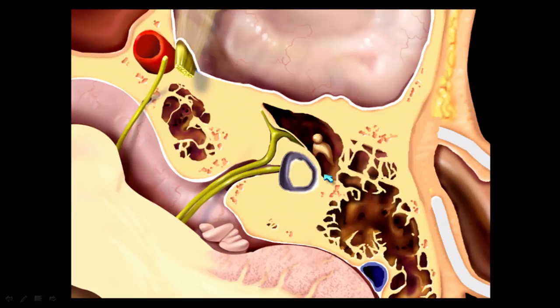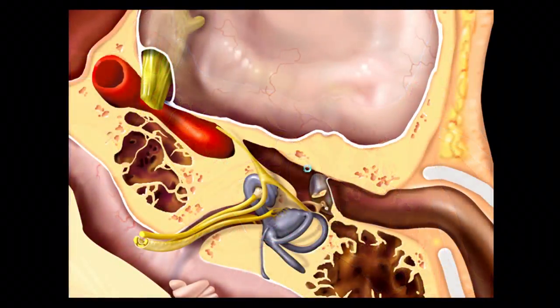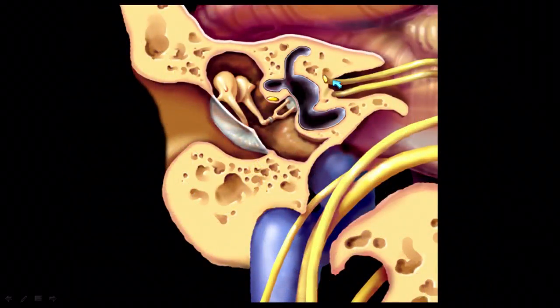Then we have a part going back through the temporal bone, so that's our tympanic segment, and it goes just under the lateral semicircular canal. So here's that tympanic segment going back posteriorly, and the greater superficial petrosal coming anteriorly, and that goes just lateral to the horizontal segment of the carotid here. And the coronal plane, here's our labyrinthine segment coming towards us, and the tympanic segment going back just under the beak of the duck, the lateral semicircular canal.